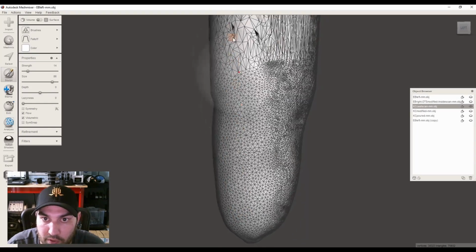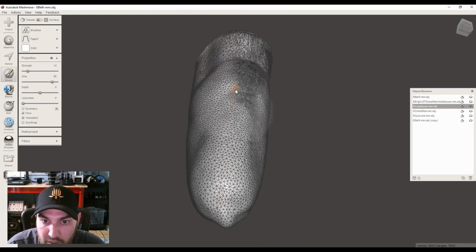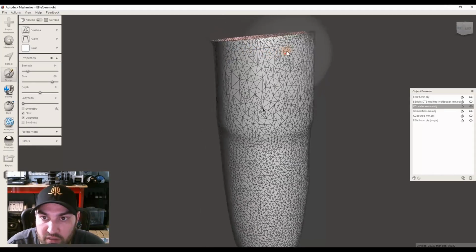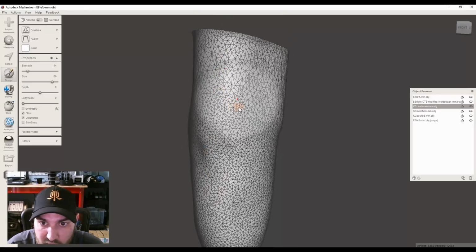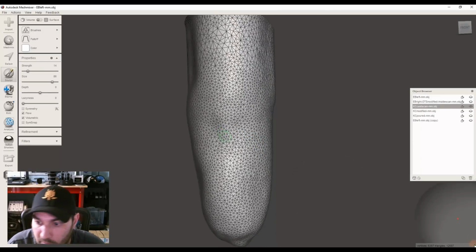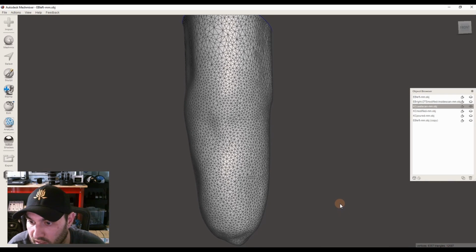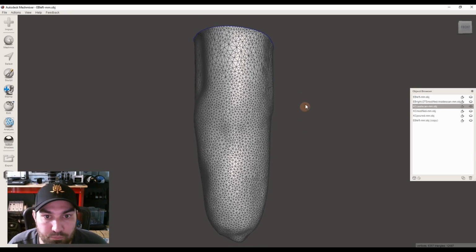Depending on what you're doing, this might not be a necessary step, but there are some things where you definitely need to do this, or if you're exporting this to work with it in Fusion 360 or some other CAD software that doesn't handle dense meshes well, having a reduced mesh will help. And then you can look at your triangle count down here and see where you ended up. So that's almost 12,600. That's not bad. That's not too many triangles to work with.